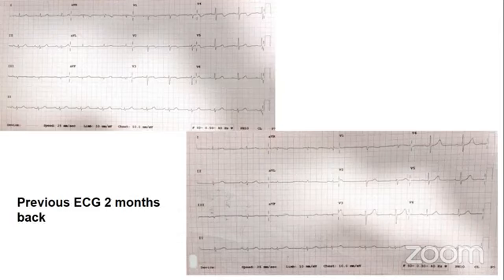But I warn you of a few things. False Wellens can be possible, particularly in LVH. In LVH, sometimes with a little bit of adrenaline surge, such as cocaine, it may look like Wellens, but it is actually false Wellens. We need to recognize that. That is not common, but mostly, if the patient has ischemic chest pain and you have no other explanation, like associated LVH or any valve disease with LVH, then this biphasic T wave with chest pain is ischemic.